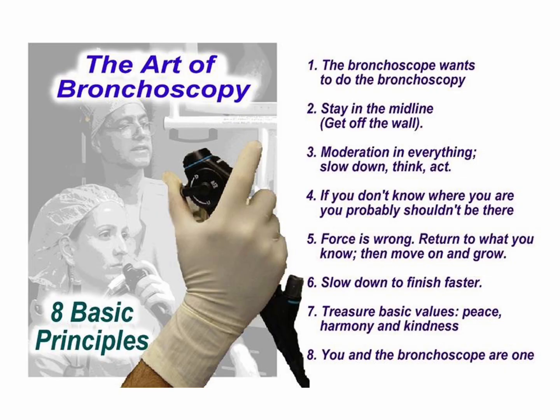In this lecture, we reviewed common bronchial abnormalities encountered during bronchoscopy, including mucosal disease, airway obstruction, strictures, postoperative anatomy, anatomic variants, fistulas, vascular abnormalities, and malignant lesions.